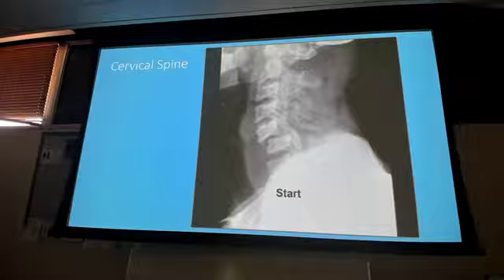Here's C6. This is supposed to be C7. I can barely make that out in T1. That's why with the laterals we count from the top down, because depending on the patient, all that shoulder or soft tissue, you might not be able to make out that full cervical spine. So we start up here. So C5, C6 anterior spondylolisthesis. If you didn't get it, don't worry about it. We'll have more practice at this, and you'll get better at it.